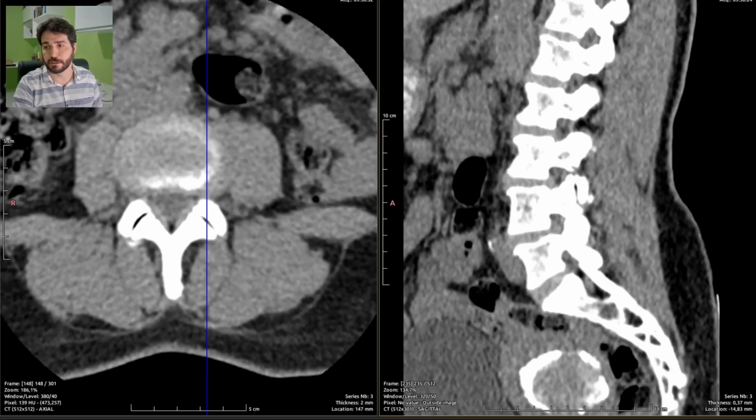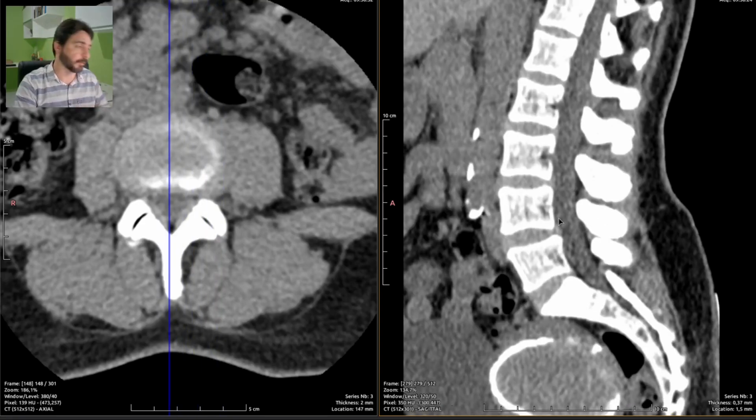L5 and S1 segments. So I'm going to report this, and feel free to skip ahead if you just don't want to watch me mumble as I type in what I have just found. So my template is almost ready. Just going to make a few modifications. Just adding the L5S1 extrusion, left foraminal extrusion.